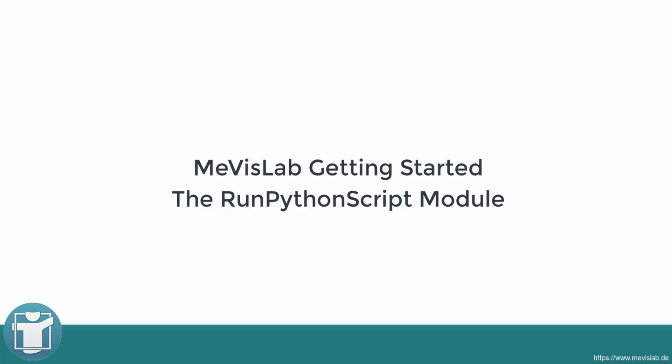In this video, you will learn how to use Python scripting in MeVisLab. We do not explain Python in general but explain the module RunPythonScript.